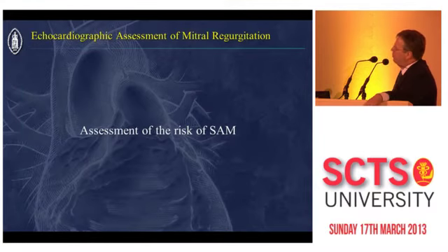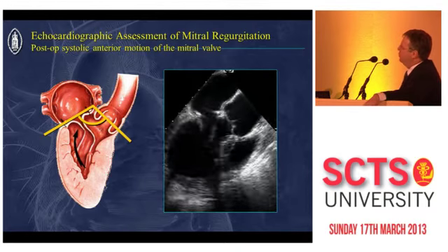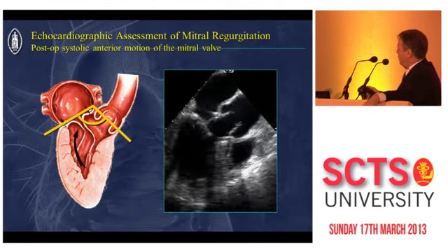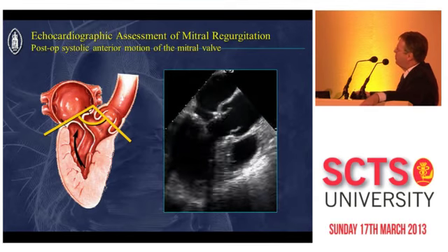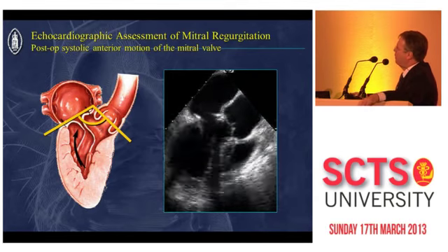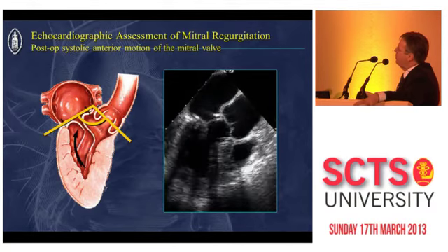I've been asked to talk very briefly about the risk of SAM. This is, of course, a very important complication of mitral valve repair. Fortunately, it is becoming rarer than it was before. And you can see already in this example a typical situation.